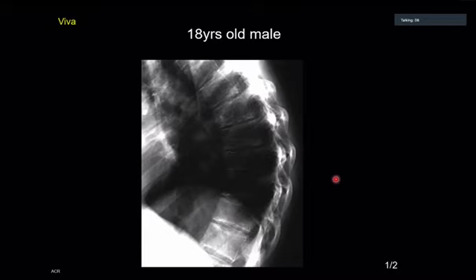No, I just said that because I didn't see the patient's age, so that's my mistake. Okay. And I agree the density could be the projection. But there is definitely decreased height of one of the vertebrae.